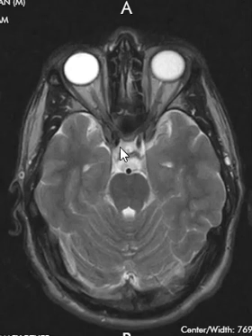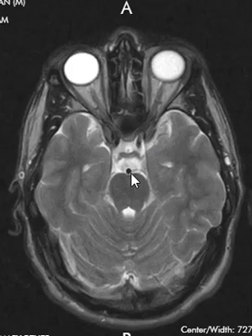And you may notice these little areas of darkness. These are blood vessels, normal flowing blood. We have two things in the front that are like each other. This is the right and left internal carotid arteries, or the cavernous carotid arteries. And there's another one back here. This is the basilar artery. And we call this the anterior circulation, posterior circulation.